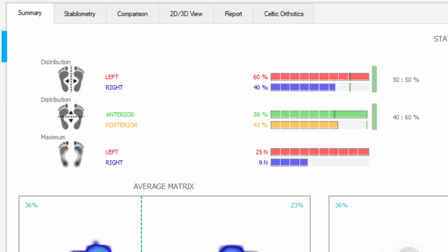Unfortunately, the value given in this way cannot directly be equated with a sway back or forward-leaning posture type, since in the upward construct various pivot points can provide alignment correction. For example, an increased rear foot load in the pelvis can be converted to a forward tilt of the trunk. This already shows how interesting the combination of spinal and foot pressure measurement is.